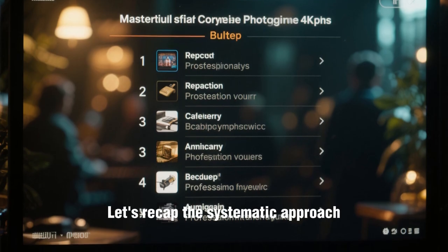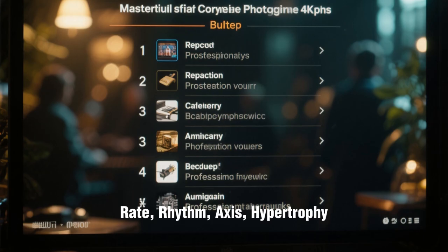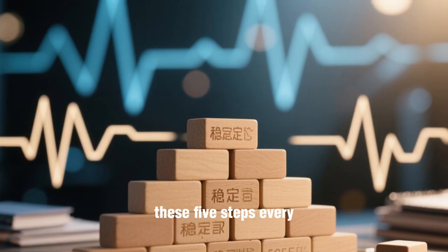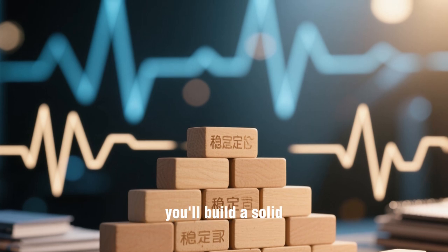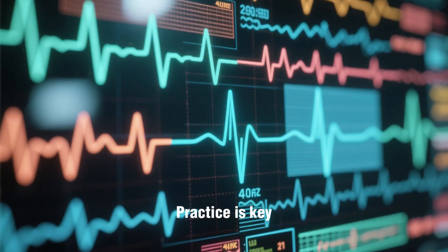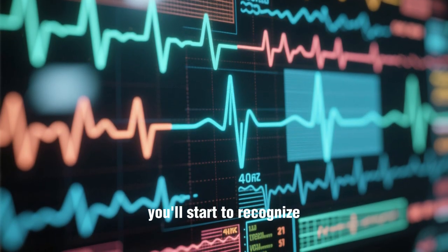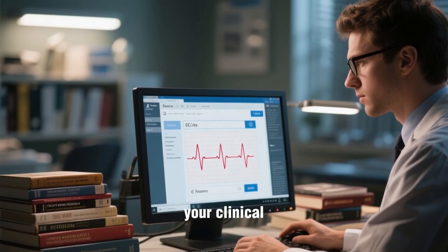Let's recap the systematic approach: rate, rhythm, axis, hypertrophy, and ischemia/infarction. If you go through these 5 steps every single time you look at an ECG, you'll build a solid foundation and be much less likely to miss important findings. Practice is key. The more ECGs you look at, the more patterns you'll start to recognize. Find practice ECGs online, in textbooks, or in your clinical rotations.